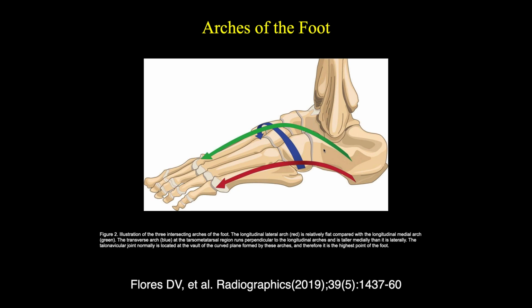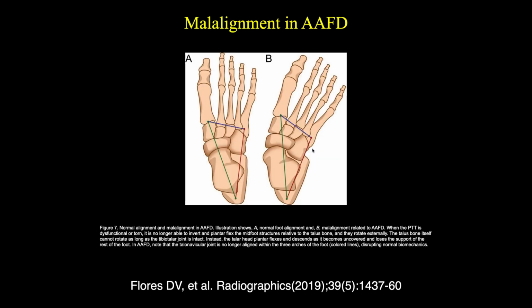And the arches that they're really talking about are the arches where you go up along the dorsal aspect, really involving the second metatarsal bone, the coronal plane up around the cuneiform bones, and then the plantar arch, which we see down here. And you can measure those differently, but basically all three of them become abnormal and flatten out when you get posterior tibialis tendinopathy over time.